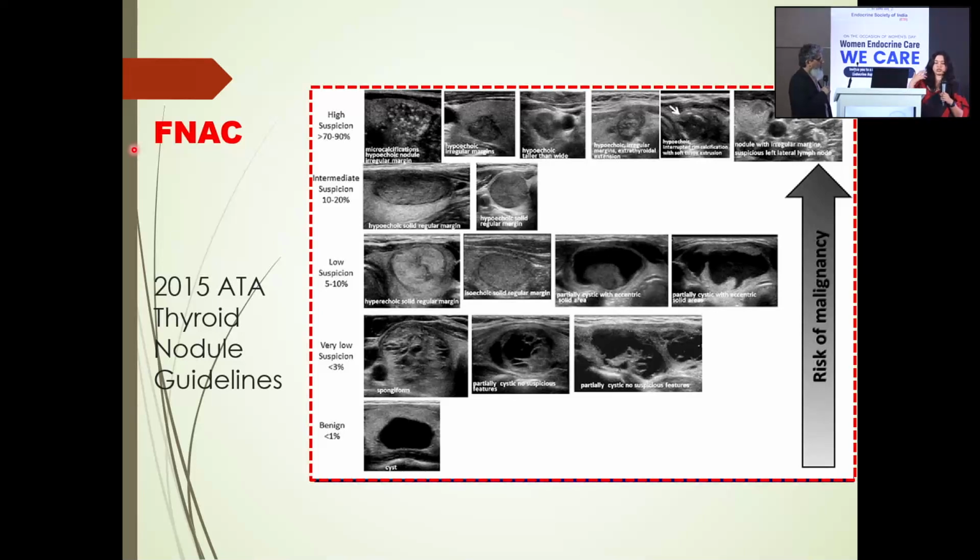So these are all the features which help you understand that this is a patient for whom I might have a lower threshold. Practically, though, as per the TIRADS, it may not fit exactly into that size of nodule. Or sometimes if you have a family history of thyroid cancer in that patient, or a neck radiation history, these are all important markers which make you think that you might have a little bit of a lower threshold, and that's exactly what the guidelines say. Do you agree, sir? Yeah, I think one additional point in ATA, generally it includes the nodes, so that makes it a little more specific, by which radiologists or clinicians would go back to their scenarios in that particular case.